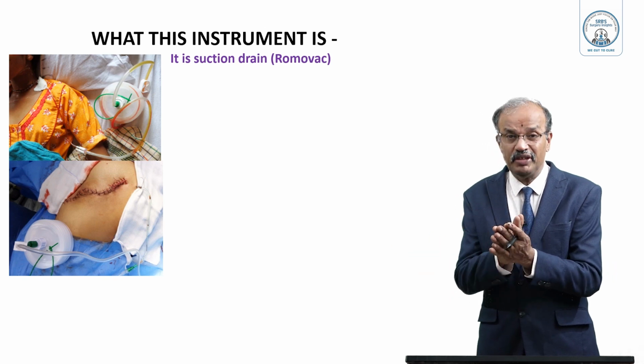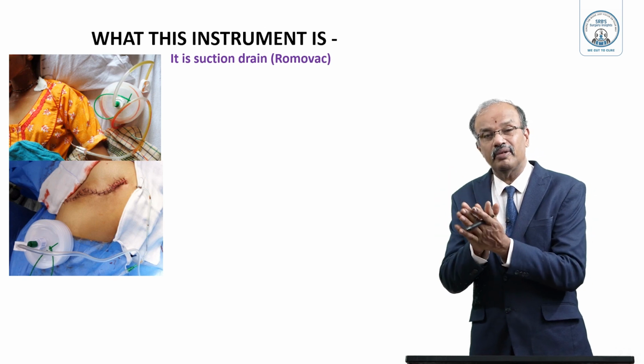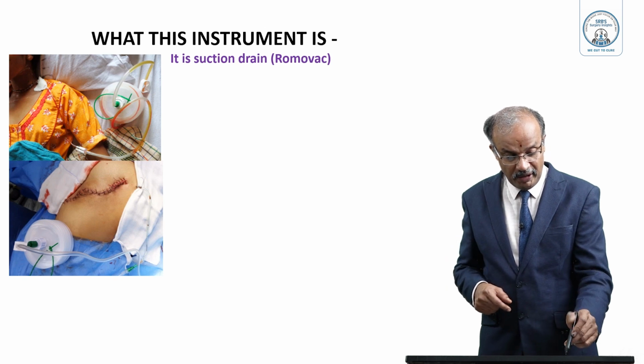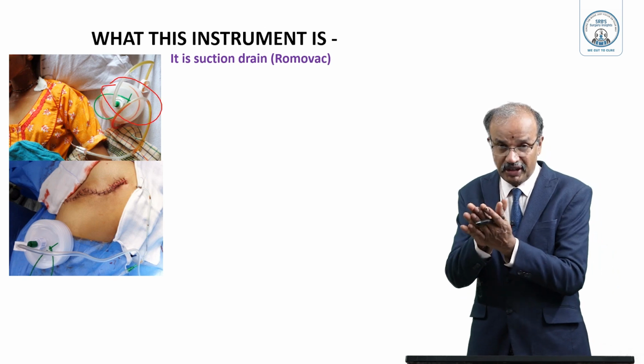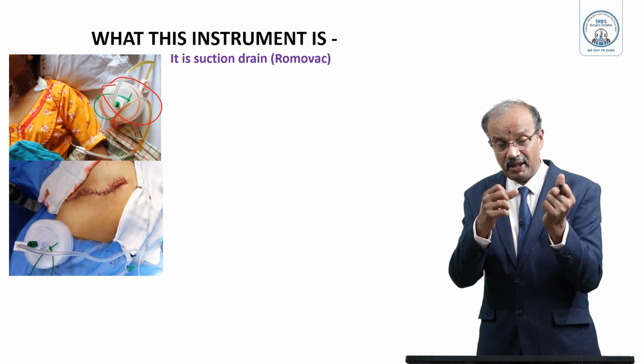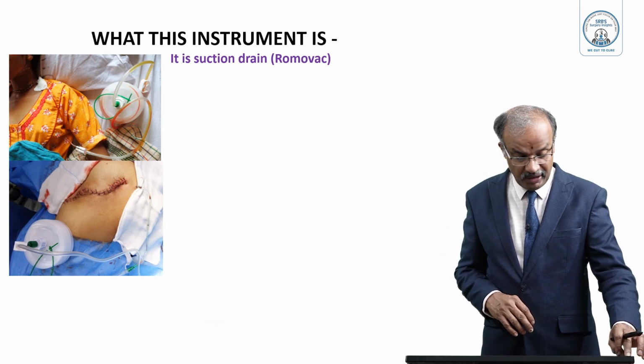Suction is created by pressing this corrugated tube, this suction tube actually. By pressing this, it can press and expand. It creates suction by negative pressure and sucks all the fluid. So that is the typical suction drain.